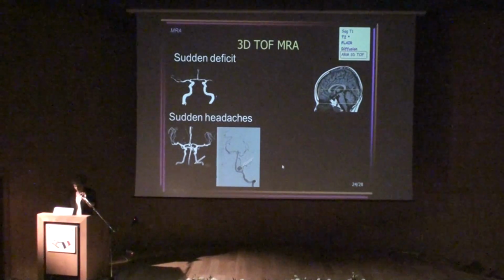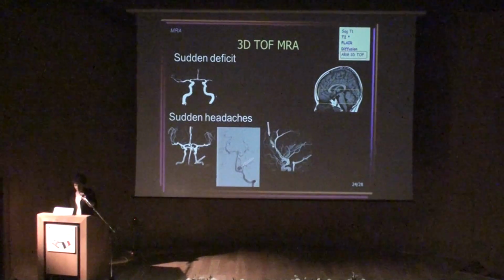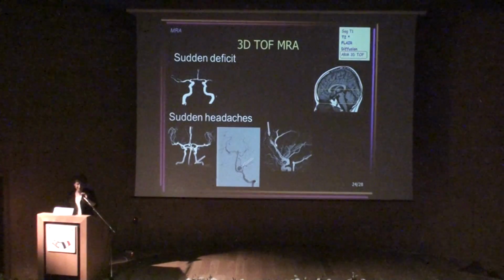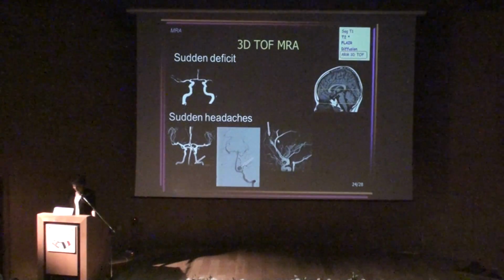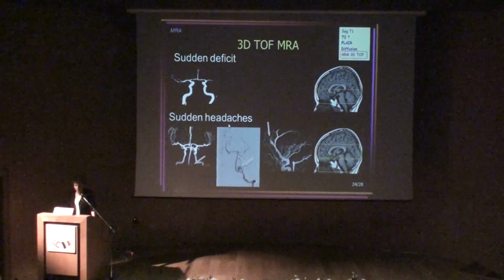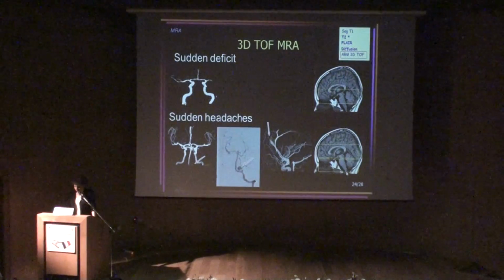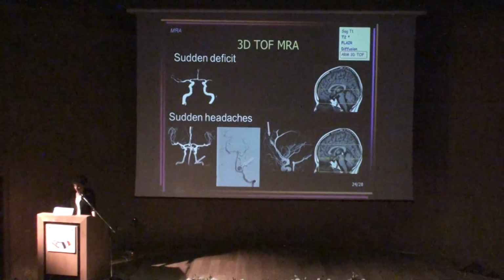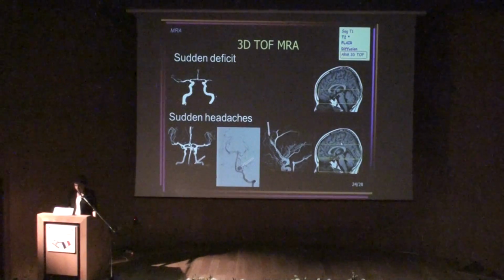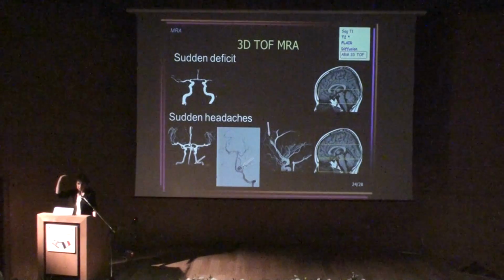So you might as well miss some aneurysm of the pericallosal artery here. The message is that every time a patient comes with sudden headaches, you should run 2 slabs and cover from the foramen magnum to the top of the corpus callosum, to cover the lowest aneurysm location and the highest one.